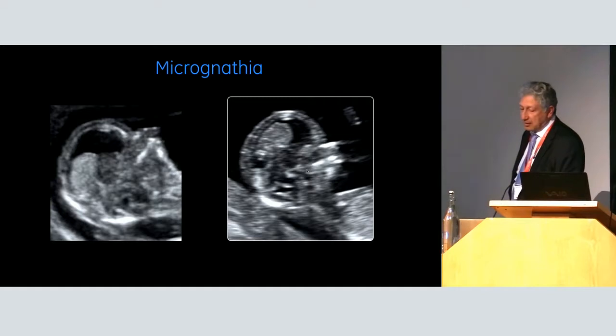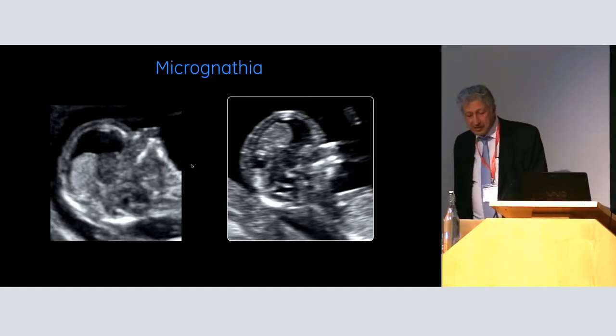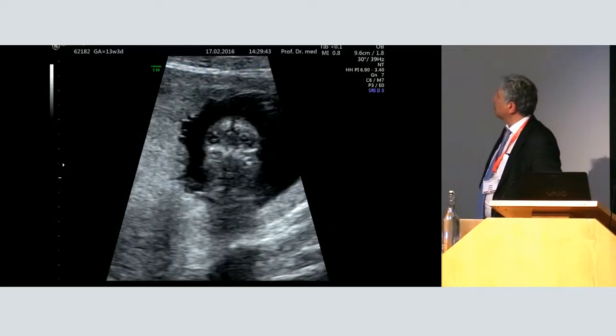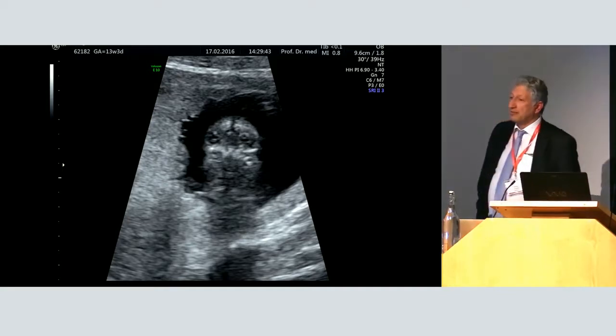So these are other cases, unless you have additional signs, because this Pierre Robin appearance may be found also in genetic diseases, also in trisomy 18 and others, so be careful. And one of the approaches which is very nice, and I want to spend a few minutes on it, is provided also by Waldo Sepulveda.